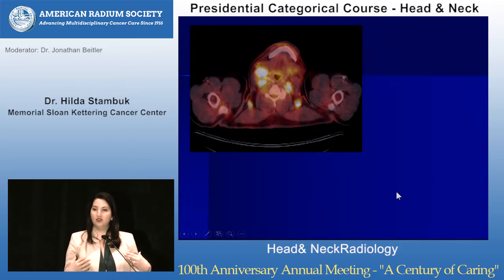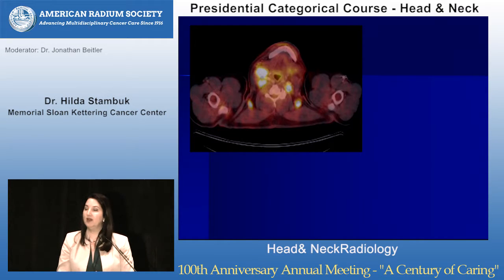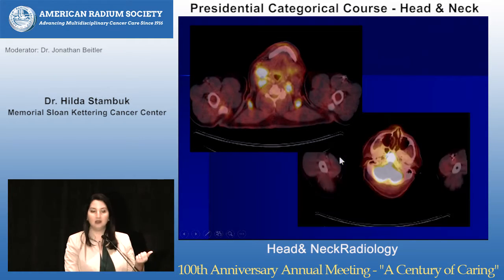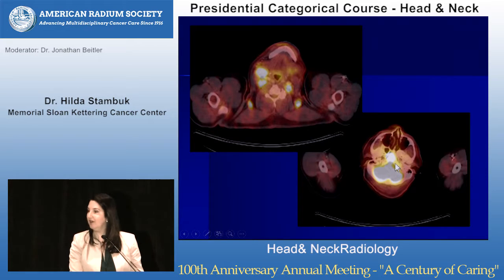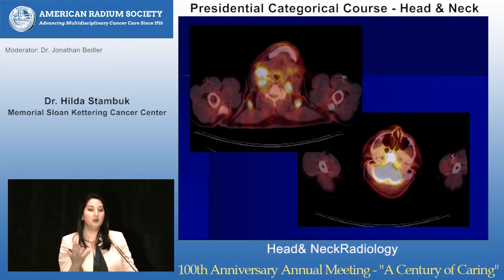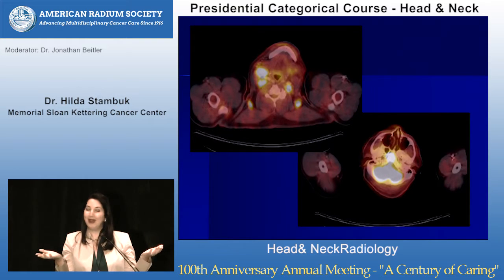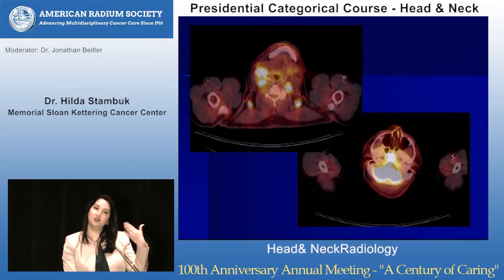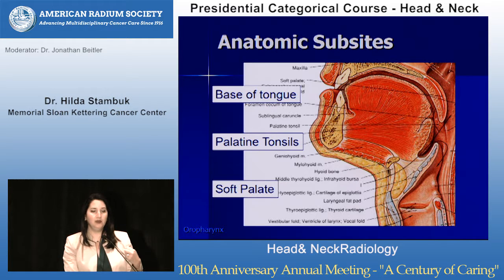So this patient also came with a PET. I want to incorporate in this talk that PET's wonderful, but I'm going to show you ways that we can trip up, because it helps in many ways, but I want to keep you out of trouble when it can be a trip up too. So here's this patient's PET from the outside. You can see there's bulky disease bilaterally, level 5. We should be thinking nasopharynx. But notice that the clivus is very FDG avid, so how was this missed? I want to propose to you that possibly when you're looking at 1,000 images on PET, because they do the whole body, this probably was confused with brainstem. So don't make that mistake. I see that a lot, clivus FDG avid with various tumors, and you're looking at images fast and you think it's brainstem.